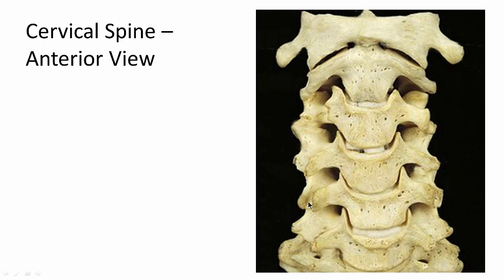And remember, there's a special name for the section of bone between the tubercles, intertubercular what? Intertubercular lamella. Just like the lamella that make up the annulus of the disc. Lamella, intertubercular lamella. Here's a much wider groove. I think we got the point. There's a lip. The bodies often have these lips coming off them.